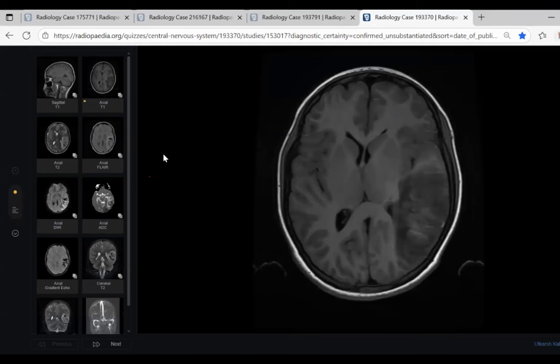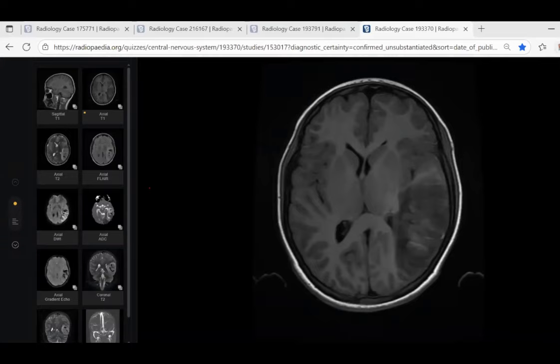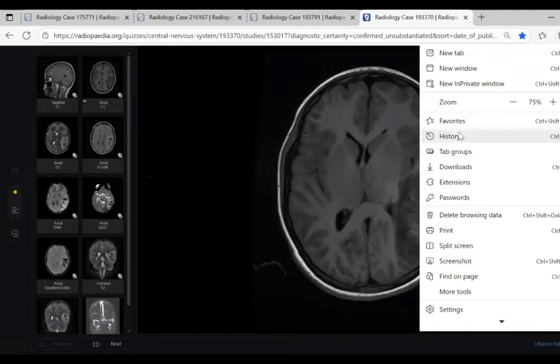The lesions you were showing just now for the meningoencephalitis, can they be infarcts due to vasospasm, which is also a complication of meningitis? See, the scenario of the case is running towards TB, especially after I showed the pleural effusion.